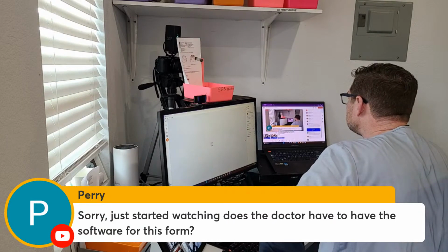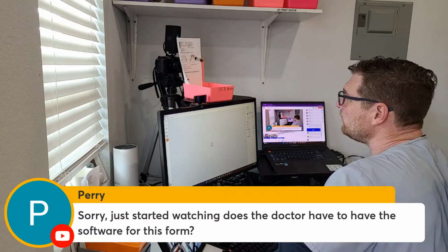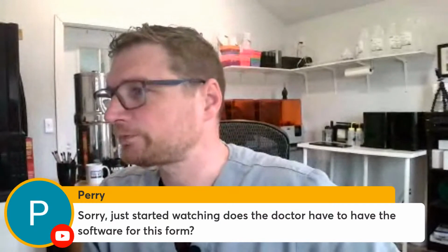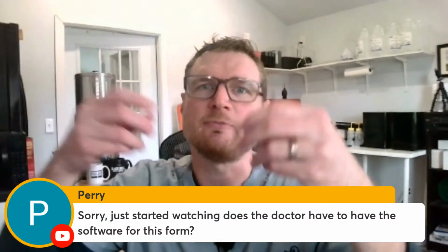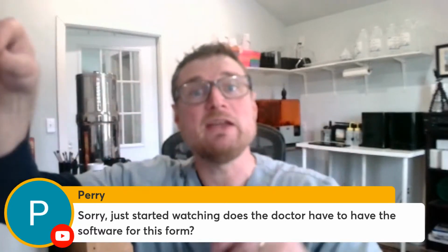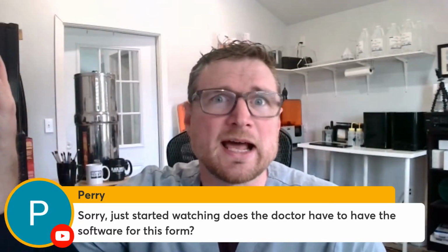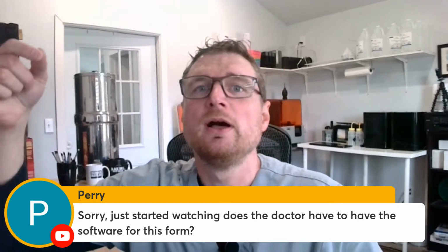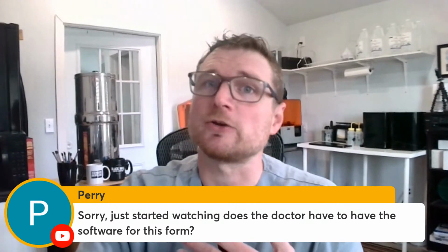Does the doctor have to have the software for this form? Yes. So they have their own EasyRx software, so they have their account. We have my account. Now, the lab can pay for their basic account. EasyRx charges $1.29 per script. So you get to pay for the doctor, or the doctor can pay for themselves.